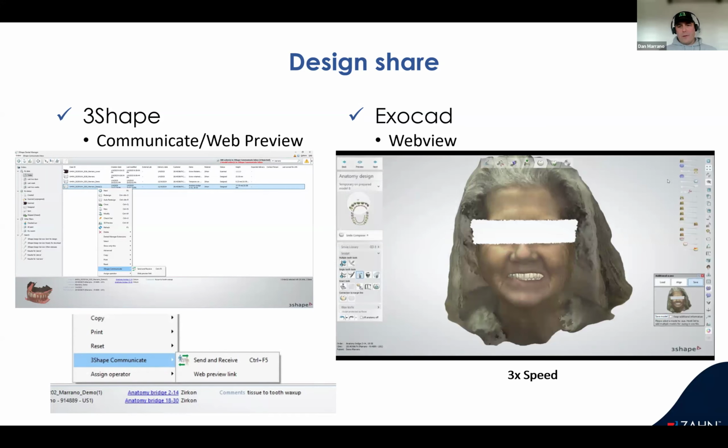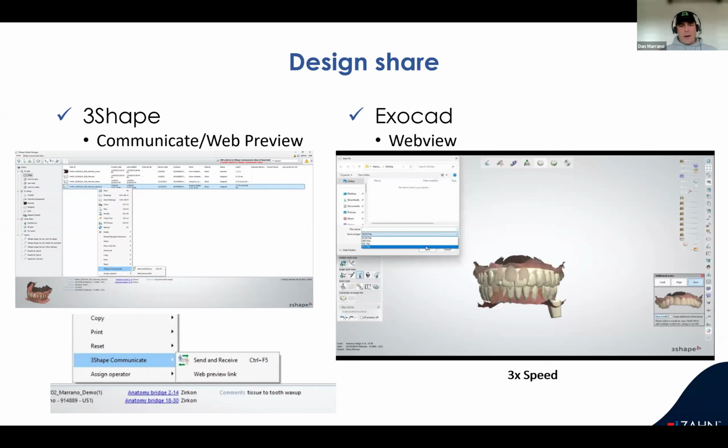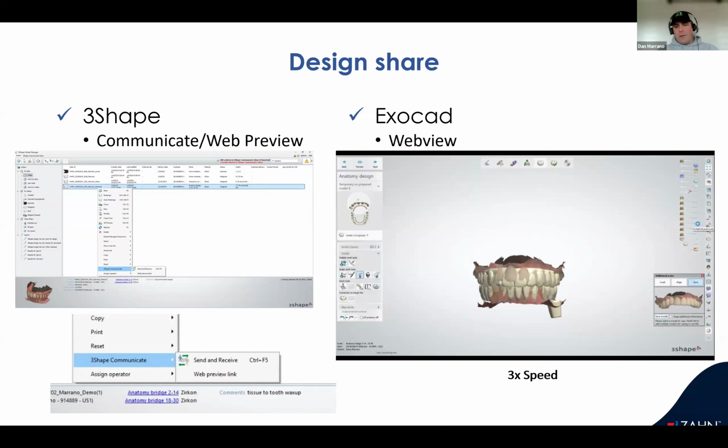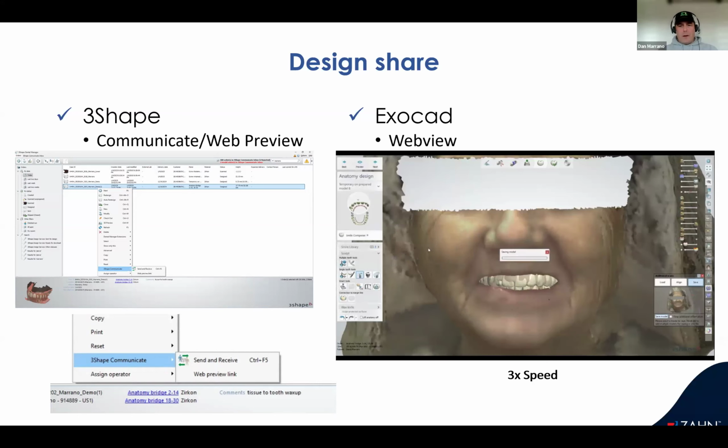Now I saved this facial scan as an STL there first. You'll see, I'll go back and save it as a PLY, because when you bring a facial scan in as an STL, the black and white kind of looks like a Cabbage Patch doll or something. It's not very nice without the color. So you start saving all the different pieces. There I go, back saving it as a PLY.